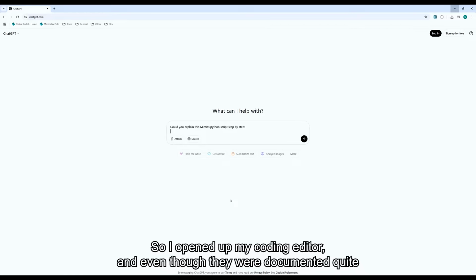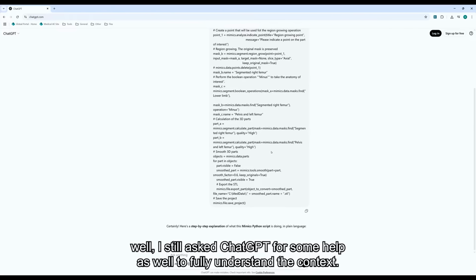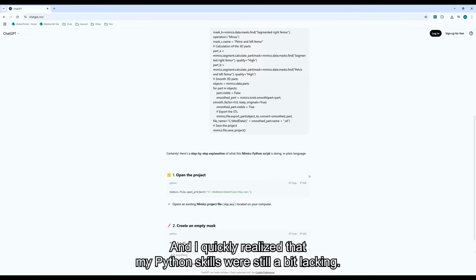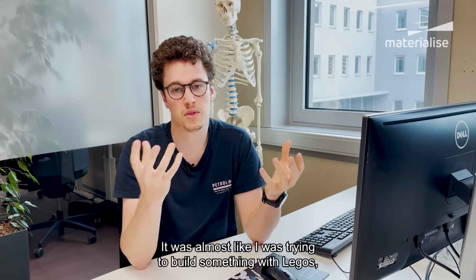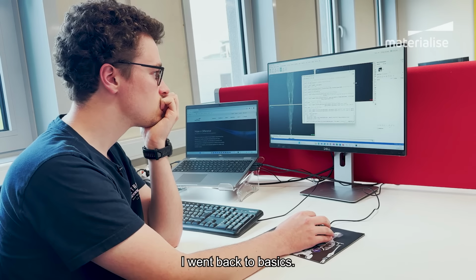So I opened up my coding editor, and even though they were documented quite well, I still asked ChatGPT for some help as well to fully understand the context. And I quickly realized that my Python skills were still a bit lacking. It was almost like I was trying to build something with Legos, but I was missing some of the important pieces. I went back to basics.